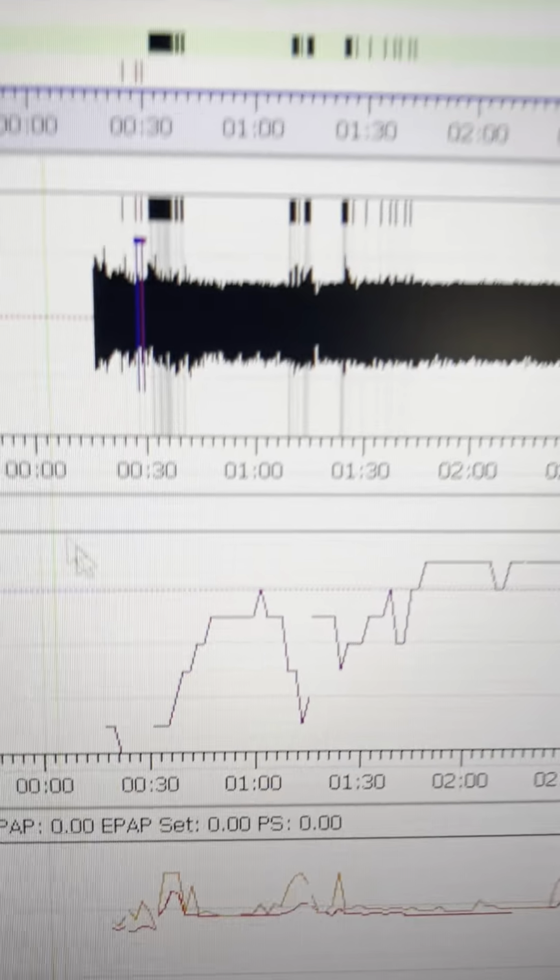So let me go here. They're also really flow limited, but right here you can see the pressure pulse. I don't know what pressure pulse means here, but you can see that I'm not trying to go higher, and there's no recovery afterwards, neither here. So I would think that even though it looks so weird, it could still be obstruction plus getting over ventilated here. So that's why it's just weird like this.